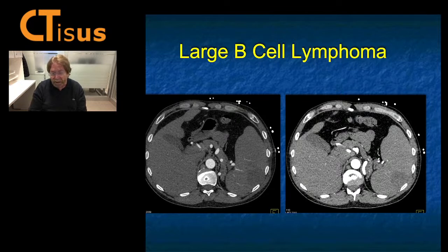Adenopathy, splenic lesion. The splenic lesion is mass-like and the spleen is large. You could think about infarct, and sometimes infarcts and tumor are hard to separate. Infarcts are usually lower density, very well defined, triangular, and sharply marginated. But this was a nice example of B-cell lymphoma.